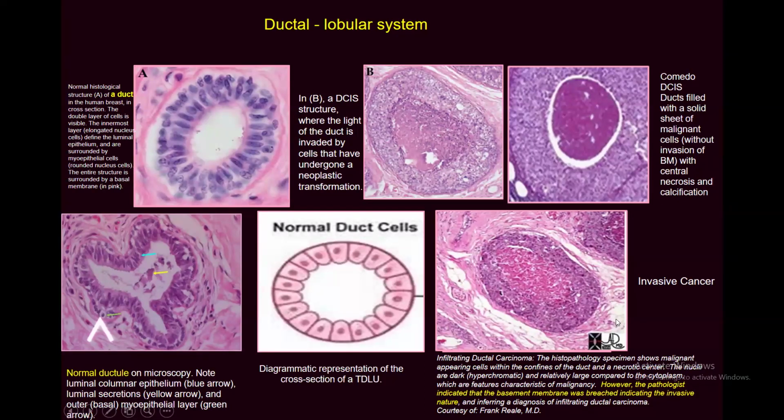The other thing is the duct in the corner, where you can see the tissue coming very close to the duct on this side. But the basement membrane is not always that obvious, as in the histology duct.